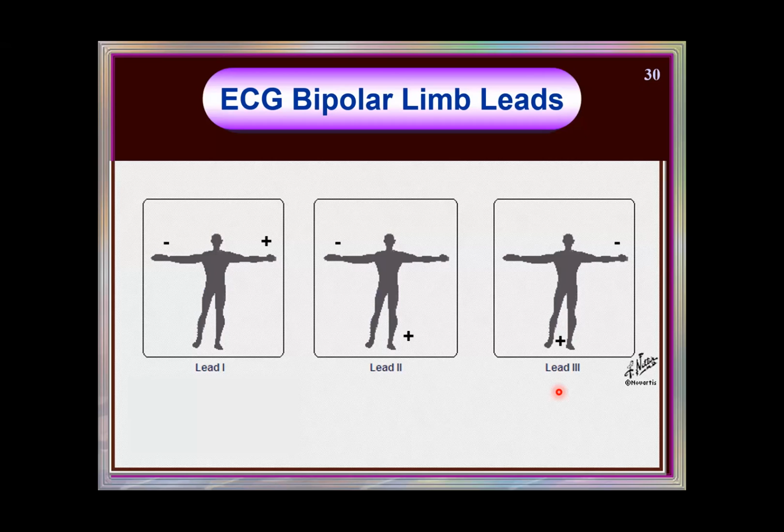Okay. So the limb leads are here. I'm going to stop in another 5 minutes probably, and then we'll go for the continuation in the next class.